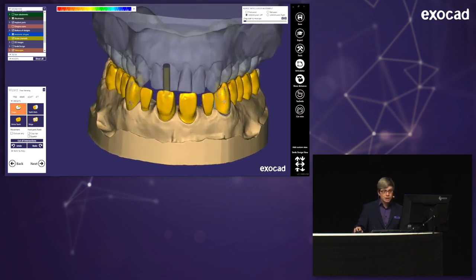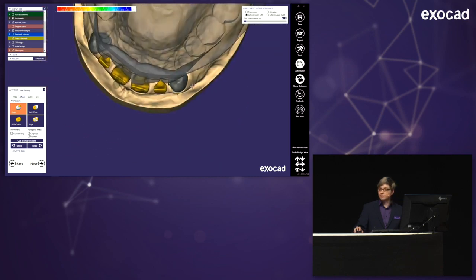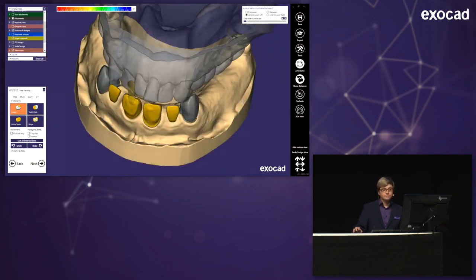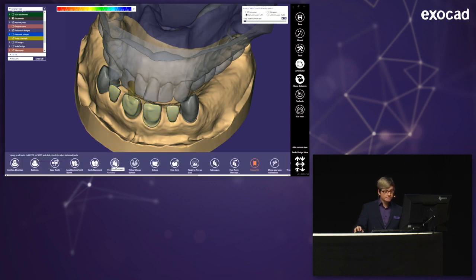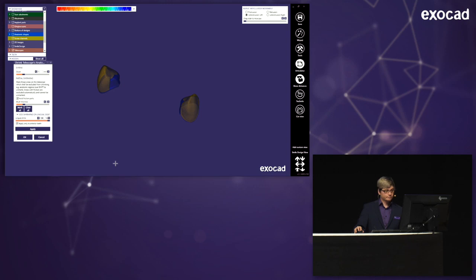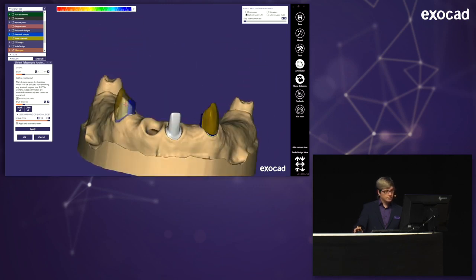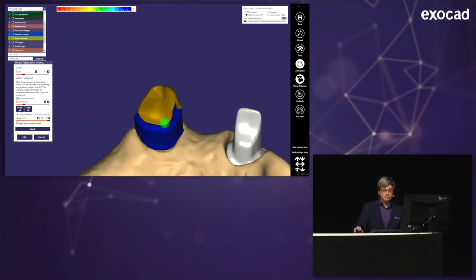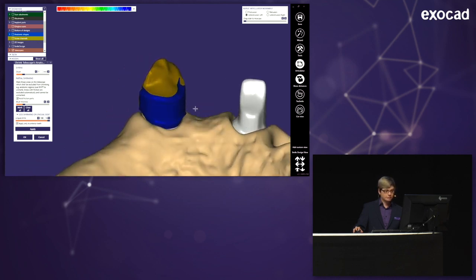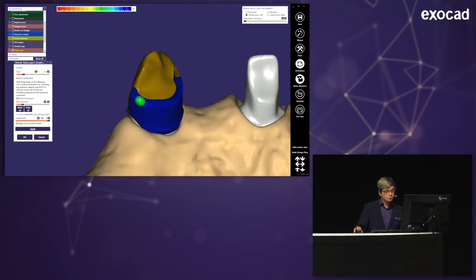And there's also the anatomical shapes of the telescopes, but not the telescopes themselves. They're grayed out. I can't freeform them now. But what I can do is switch to the expert mode, and now I have the option to choose shrink telescopic anatomy. So, and now you see two telescopic crowns, and the milled linguals are marked in blue. They're safe. They won't be shrunken if I press the button. And I can't even delete this color here, but I can add blue color here to make safe borders.